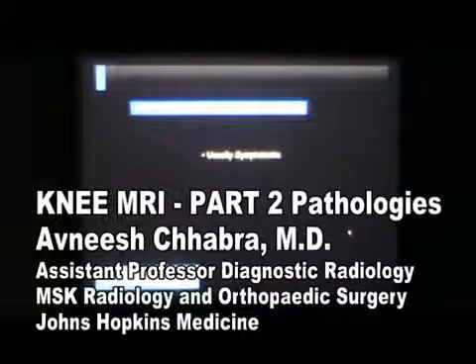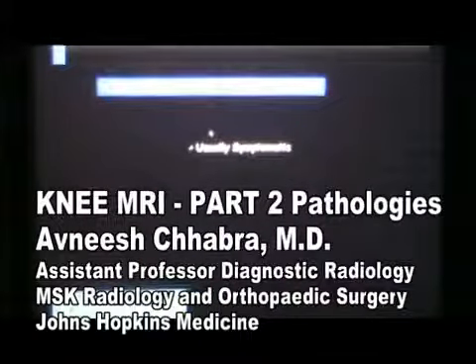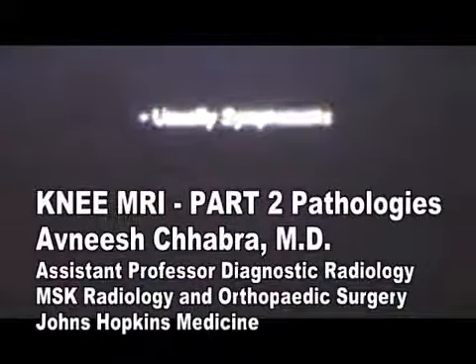So let's go over some pathologies. These three pathologies you should look for actively: bone marrow edema, effusion, and synovitis. If some patient comes with pain, he probably has one of these three things. Meniscal tears can cause pain, but that's usually because these structures get irritated.